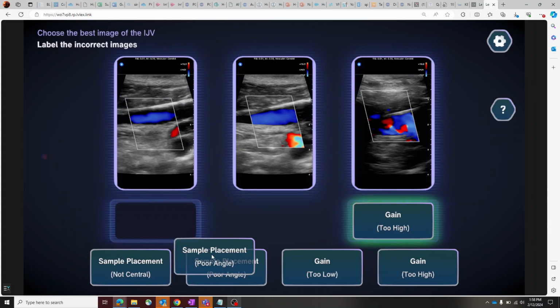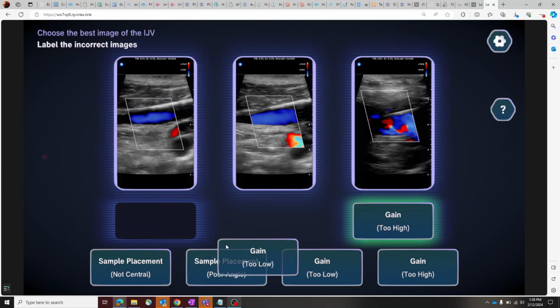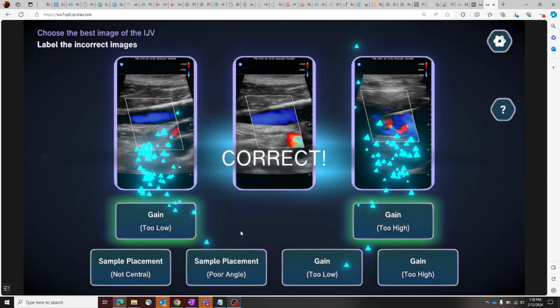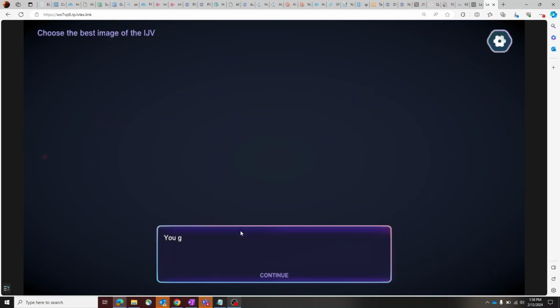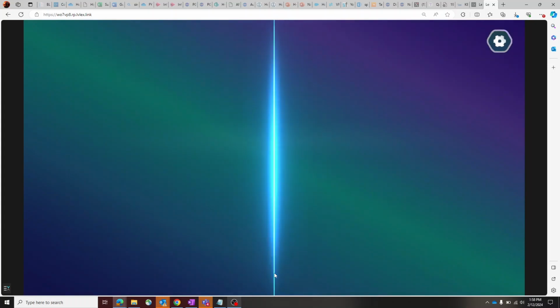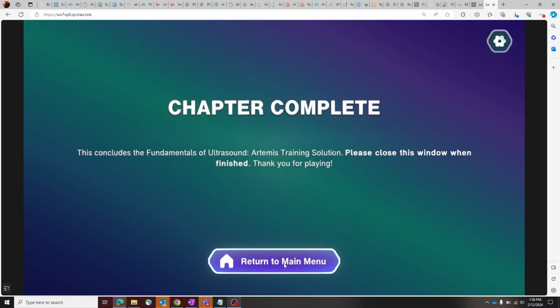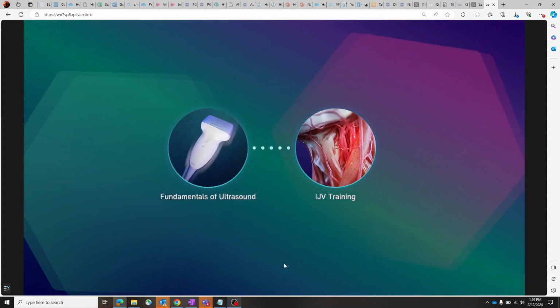When you saw the carousel of different types of probes, we had actually programmed the beams of those different ultrasounds to be representative of a common frequency found in each probe type and a common field of view that you would expect for each probe type. So hopefully in the future, we'd be able to demonstrate the need for choosing the correct probe or the correct setting in order to visualize the specific type of anatomy that you're looking at.